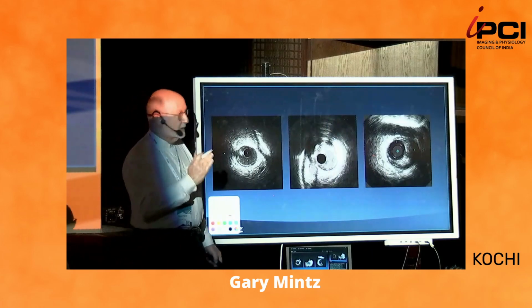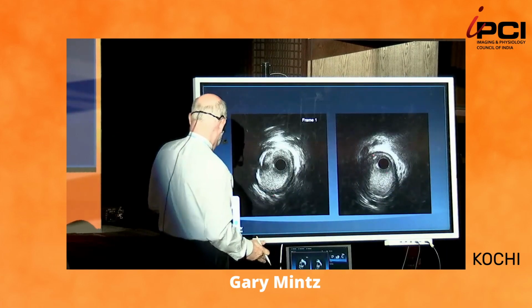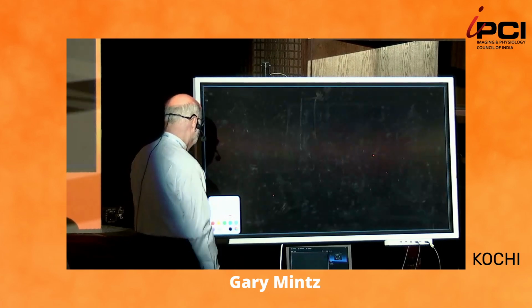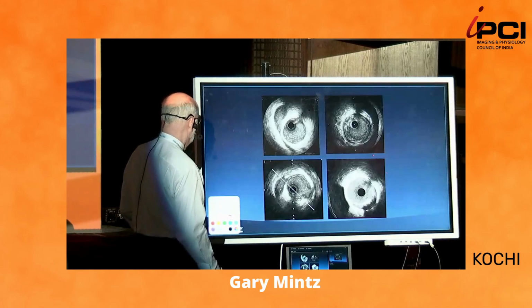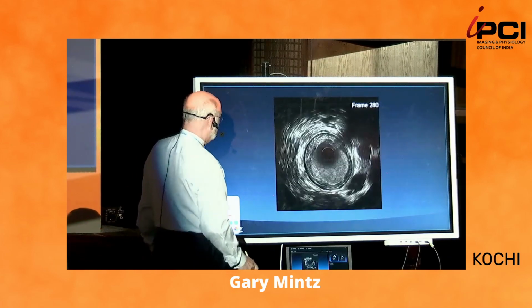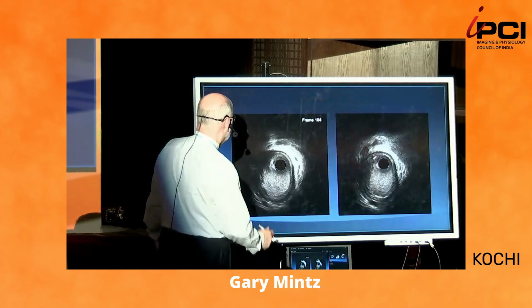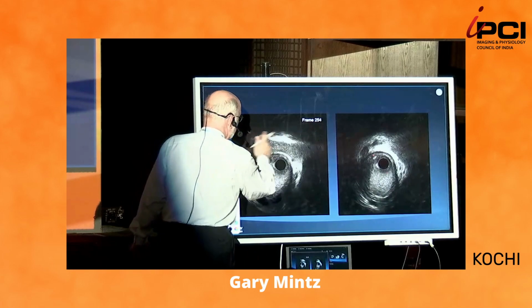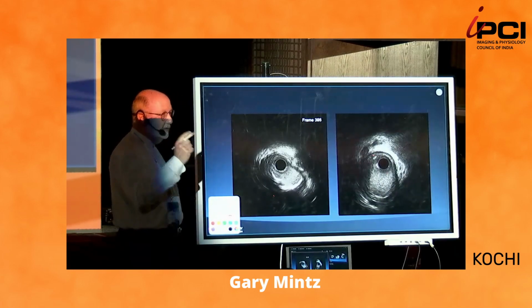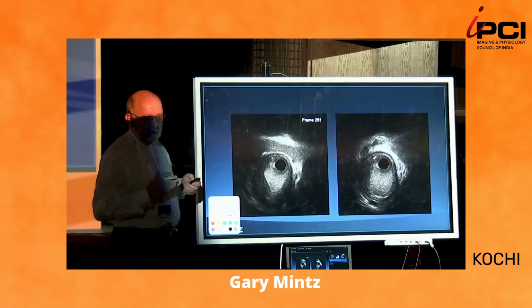Yes, it's moving. It's constantly moving. This thing is moving up and down. Let's see if I can get this to move. No, I don't have it here. I thought I had one. Oh, here it is. See, this is the pericardium. It's moving. It's constantly moving. And it's not moving in conjunction with the vessel. It's moving independently.